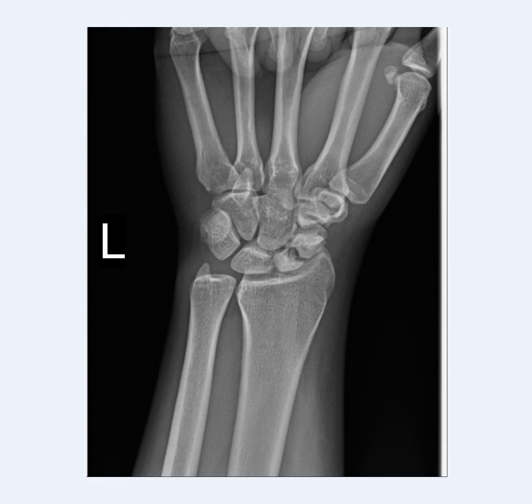Additionally, there also may be another carpal fracture instead of a scaphoid fracture or in addition to a scaphoid fracture within your differential diagnosis. But this patient was diagnosed from the very clear fractures seen on plain radiographs and on the CT.